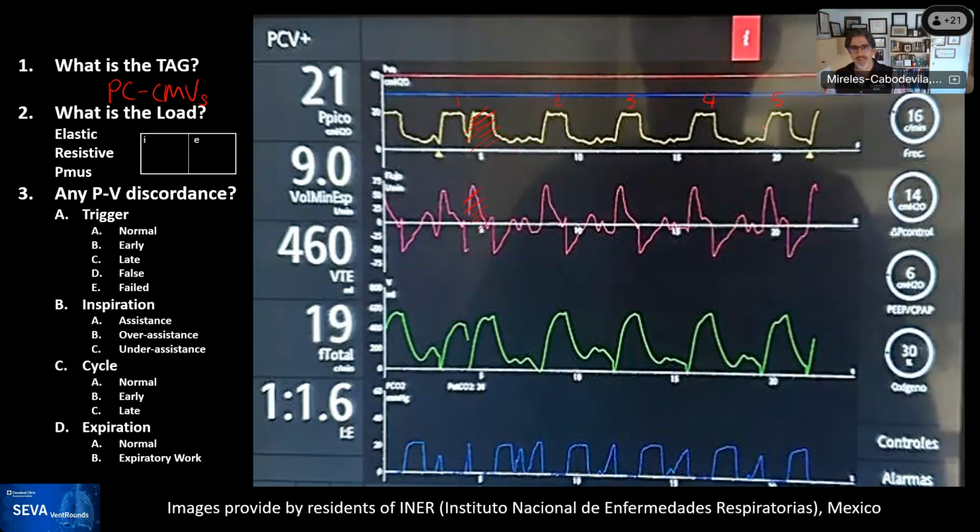Okay, and there's a little bit of a sixth that is happening back here and continues up here, but we'll stick with these five right now. And if we look at the flow, remember, because we're controlling pressure, we look at the flow. If you look at the difference between 1, 2, 3, 4, and 5, none of them looks the same, right?